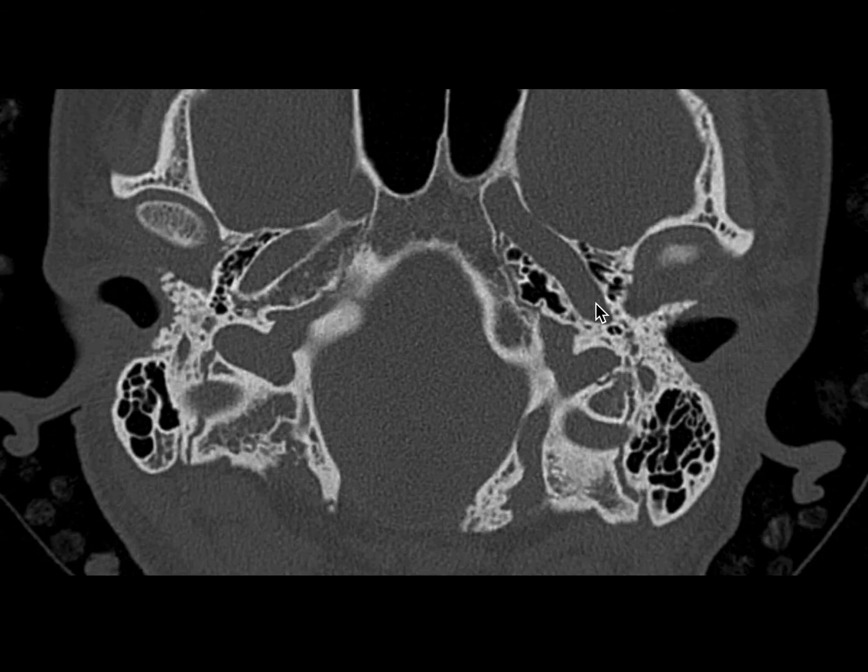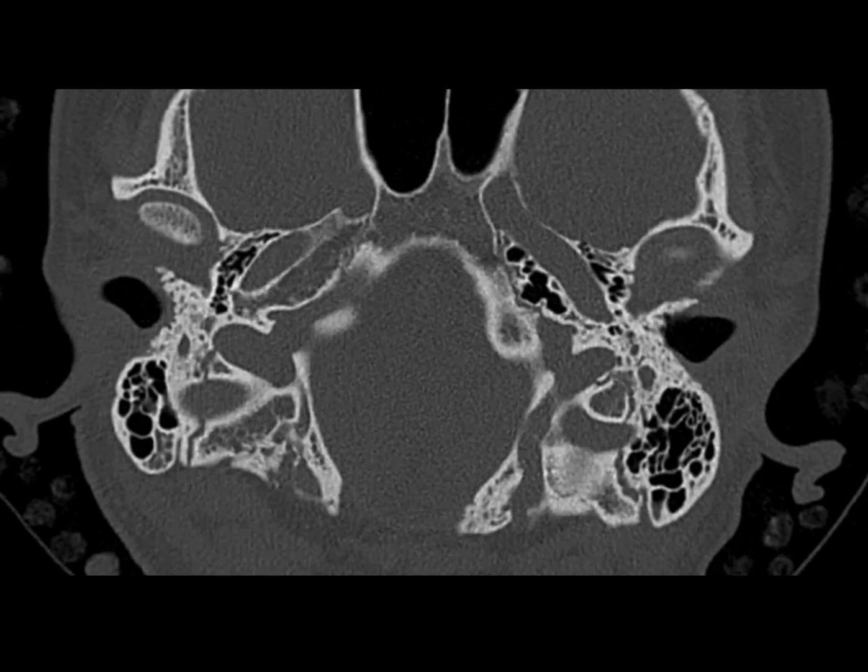The other thing to look for in these cases of persistent stapedial artery will be absence of the foramen spinosum, which usually will indicate that the middle meningeal artery no longer has to traverse the skull base, as it is coming directly off the persistent stapedial artery.